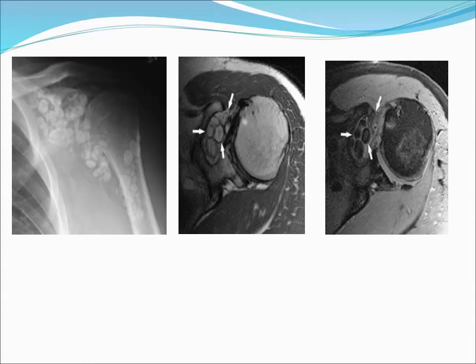Figure 1 shows that multiple intra-articular osteochondral bodies are present within the left shoulder joint, involving the subscapular recess, subcoracoid recess, and axillary pouch. Figure 2, axial PD MRA, confirms multiple high signal intensity, similar to intramedullary fat, rounded bodies with peripheral rings of thin low signal intensity, as shown by white arrows, within the subscapular recess.